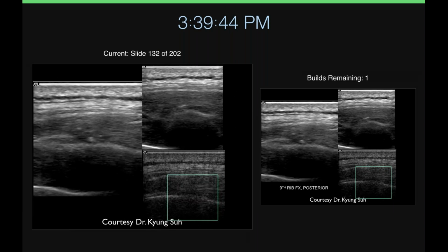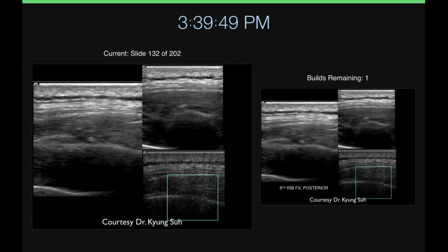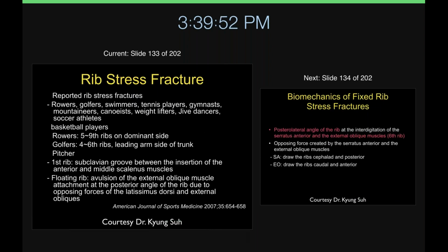Is that a rib? Rib fracture? Yeah, so this is a stress fracture of the rib. I find these difficult to make a diagnosis on X-ray based technologies, and so we usually evaluate these with MR. Well, you can certainly see displaced rib fractures on plain radiographs and CT, but sometimes they can be very subtle.